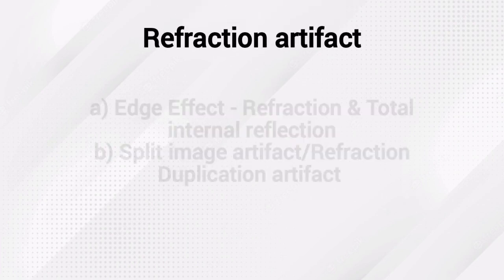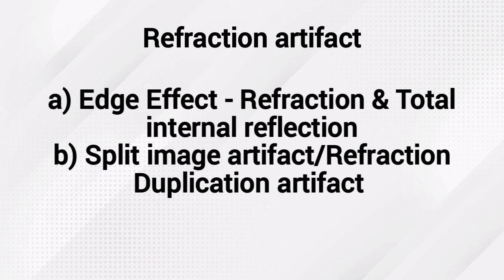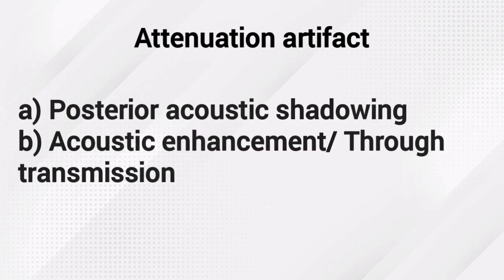Now, refraction artifacts include edge effect, that is refraction and total internal reflection. Refraction artifact also includes split image artifact or refraction duplication artifact.